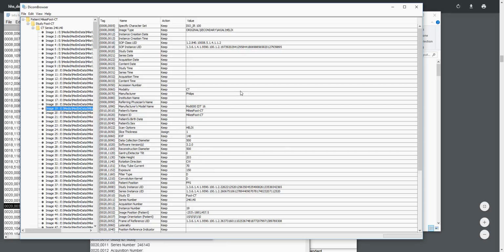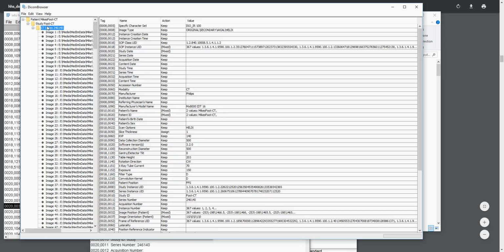But most people don't want to buy MATLAB. But for example, I put in my foot as a name. So I did that in MATLAB, but this is where you could change those values. So if, for example, your typical data is going to have all this information here that you want to anonymize, you can go in and basically select all of it. And this kind of overlaps the different image information on top of each other.